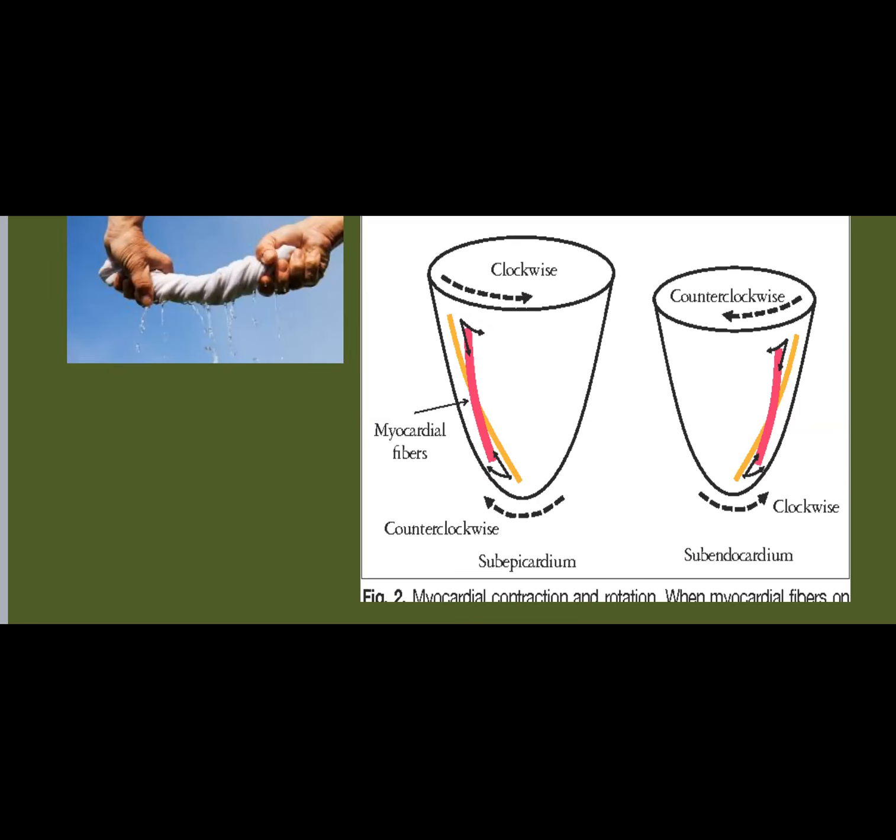Are you appreciating this movement from 2D? No. Never. Yani, if you look at the echo, you will never see that the apex and base are rotating clockwise and counterclockwise. No way to see it. You see that by strain. If you depict the strain, you will see that the apex and base are rotating clockwise, counterclockwise, and vice versa. Okay, this is one strain.